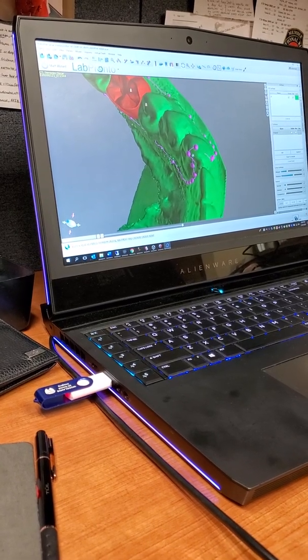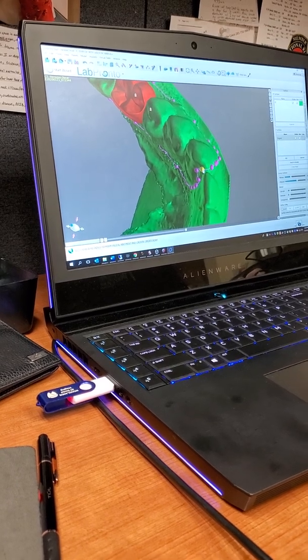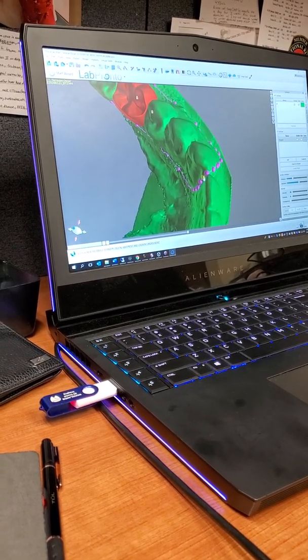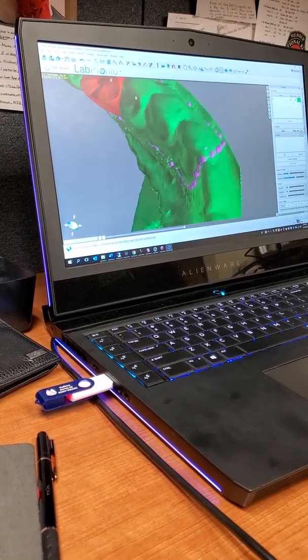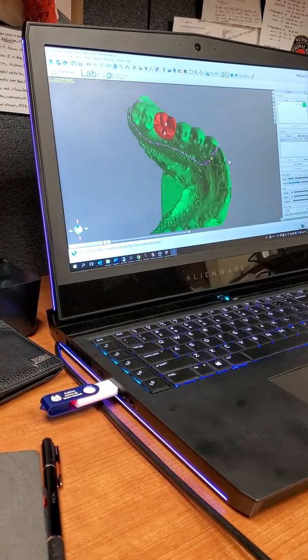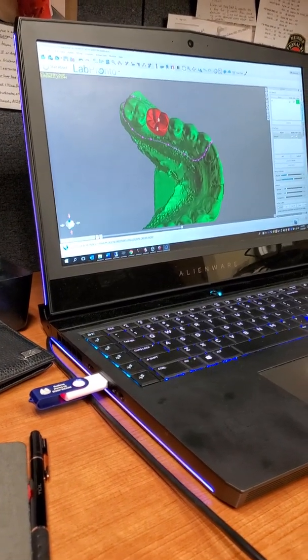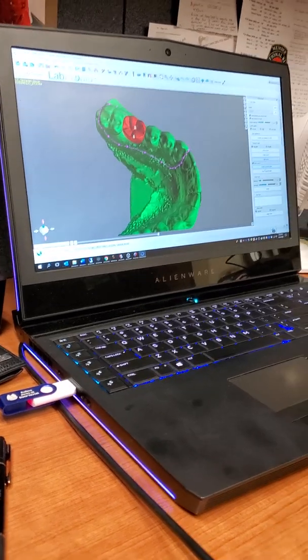So it looks like that one goes there. Hard to say how some of these get moved around sometimes, but they do, so you can kind of see. Turning the CT model off really helps. So that will be the outline of the guide right there. We know that all we have to do is go back to our guide panel and then create surgical guide.